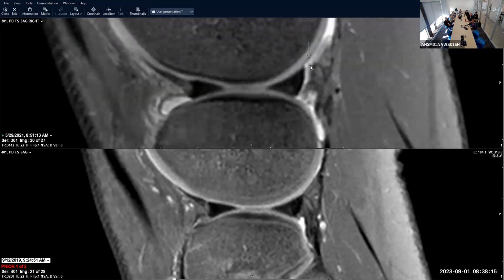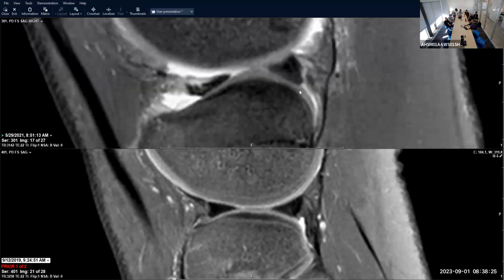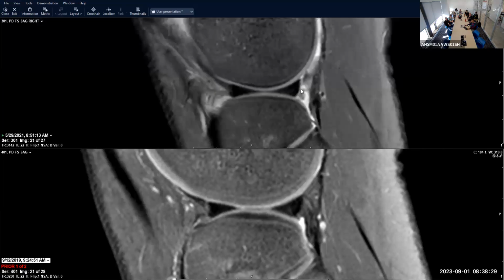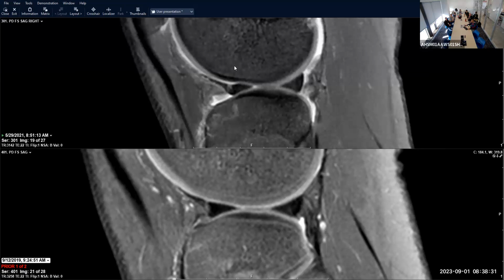I called this a meniscocapsular separation. Arthroscopically, it ended up being a vertical longitudinal tear of the lateral meniscus posterior horn that they repaired. The patient was having symptoms of instability or locking, things like that. And with the joint effusion, these secondary signs I find are useful to help me keep looking rather than just saying, all right, nothing's going on here. It just was not adding up.